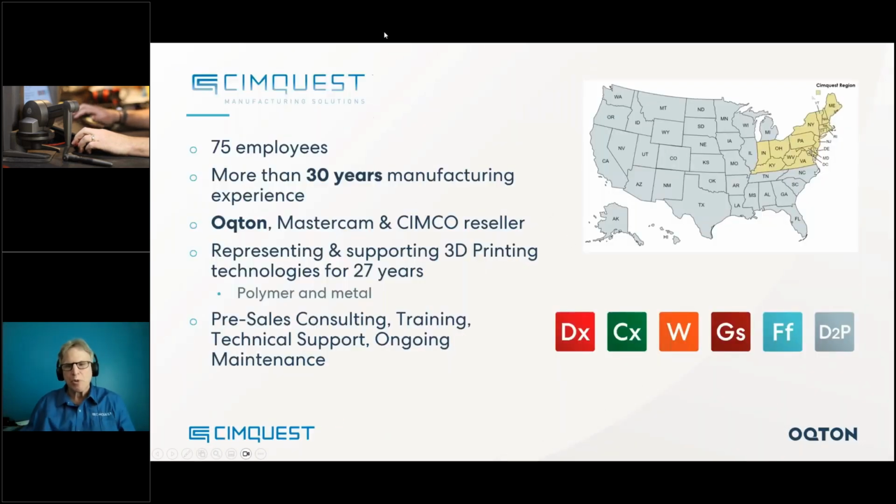Those of you that have worked with or work with mechanical CAD products, hopefully you can see the little bit of overlap between freeform and traditional CAD modeling, where you have planes, sketches, extrusions, revolves, and so forth.